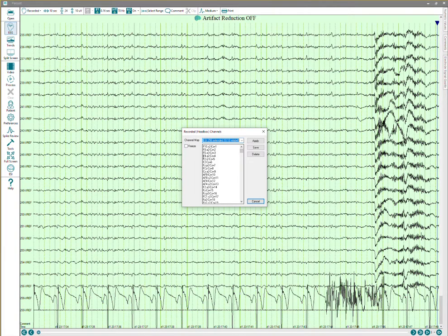But now these have 1010 labels, as well as an extended 1010 convention that was developed over at Beth Israel Deaconess Medical Center, and I believe they published on that as well. So this is actually a very nice way to handle labeling and getting an intuitive sense of location for channels that fall between those 1010 locations. Now, what we have is 257 by default labeled as Z to CZ, and then EKG to VREF 258. So let's apply this and see what happens.